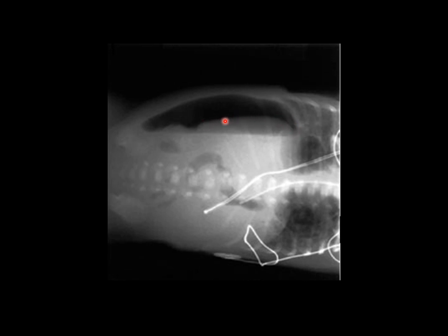So it looks like this patient is in left lateral decubitus, and the interesting thing about this case is this large air fluid level doesn't look like it's probably in a bowel loop. It could be in a very dilated large bowel, but it's more likely this patient has a lot of intraperitoneal free fluid, and then they also have a lot of intraperitoneal free gas, which is settling or floating antidependently over the liver here. So that's a good example of a pathology on left lateral decubitus view.